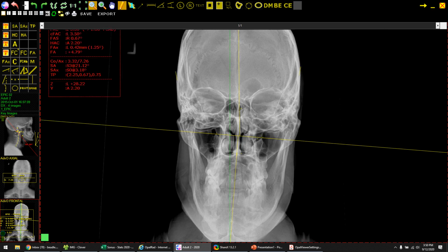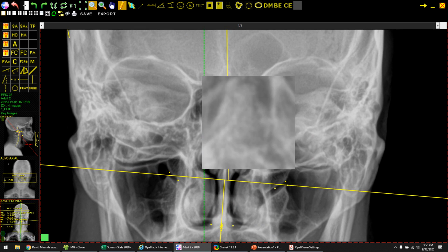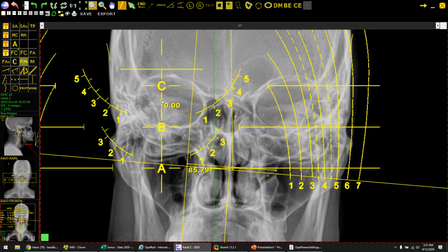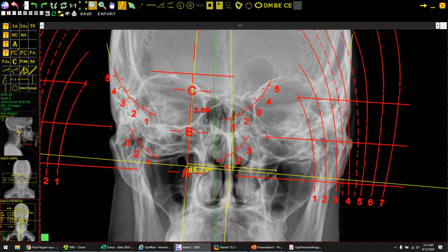The last part that we do look at is to see if the condyles are in the same plane as the skull, because it can be abnormal. One of the ways that we do that is we actually are placing a plane line on the outside borders of the condyles and then comparing that to the skull. So we have a template for this. Get it along that plane line that I described.